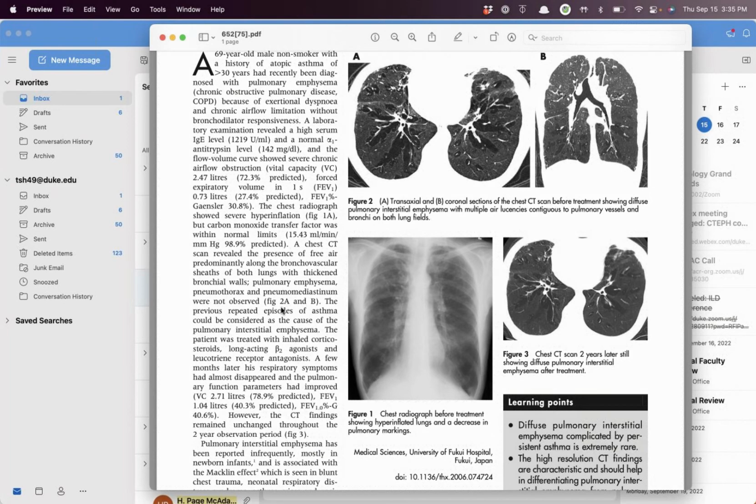Travis, it looks like your case was exquisitely along the airways. This one looks like it's on the veins as well, which is a different point. Yeah. I mean, in this patient, very similarly had airflow obstruction and COPD. So I don't know. Okay. I was just curious if anybody'd seen that. It'll be maybe a couple years before we get an answer, but it was just such a crazy case.